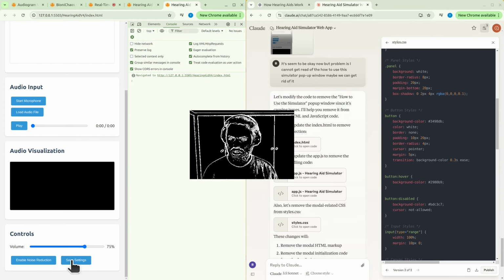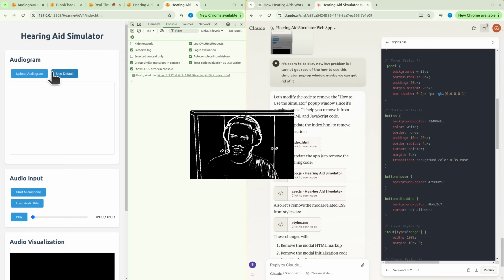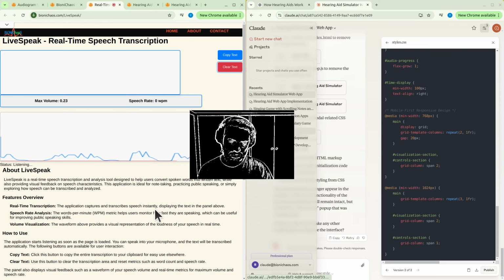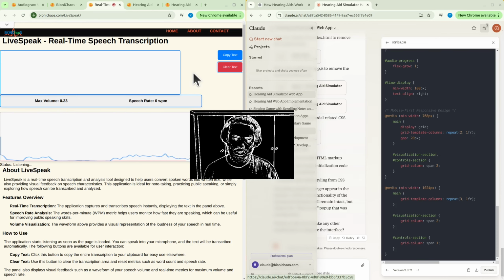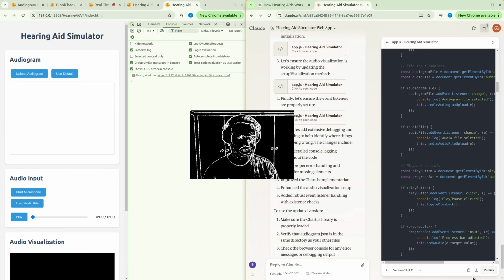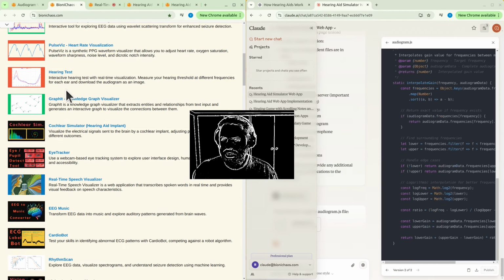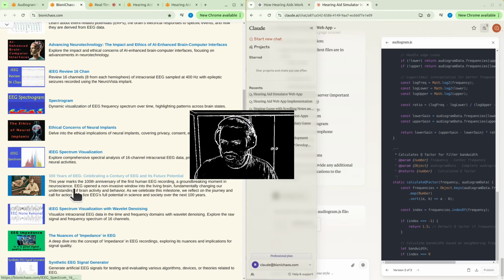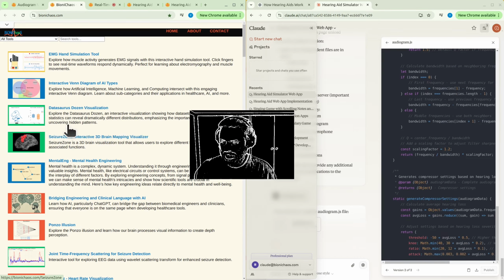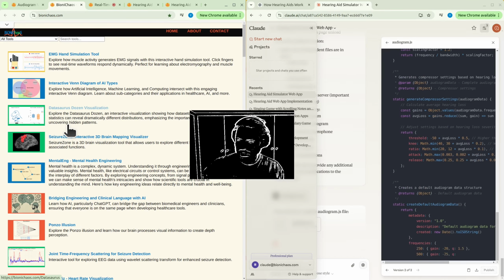Okay, the controls are meant to be for each specific band. There are no error messages, but the buttons don't seem to do anything at all. Nothing is being displayed in the charts. Using Chart.js should be fine. Okay, that's the 11th version. And yeah, while it's generating, go check out the website. You'll be helping that way a lot. Any comment is highly appreciated.